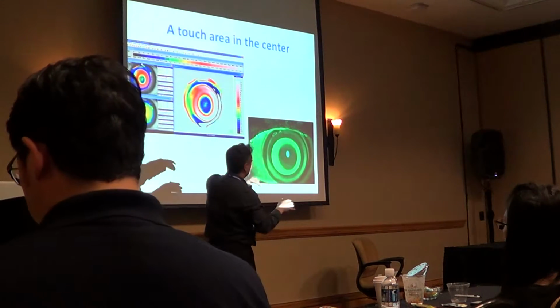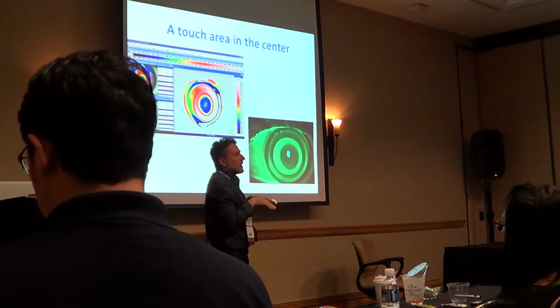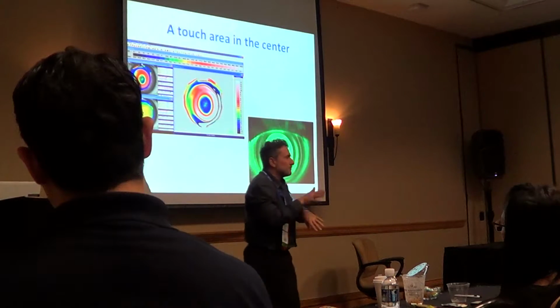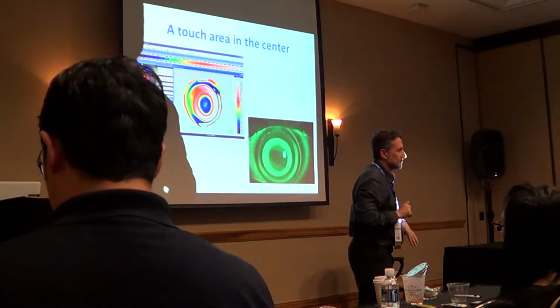Why is there no pressure? Because the lens is tilting, arriving at the limbal area, and jumping over the corner. No pressure at the end of the reverse curve.